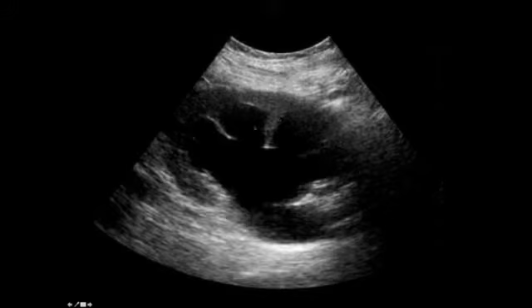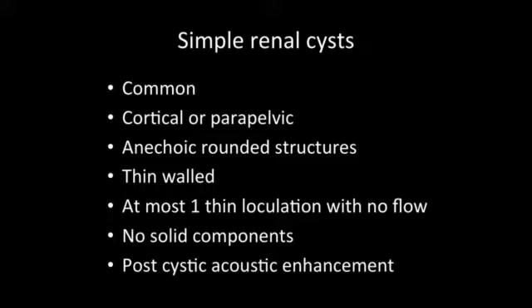Hopefully that's straightforward. Now on to renal cysts. Really all after this course I'd like you to be able to do is to define what a simple renal cyst is, because they're common. And if you see one, you don't need to do anything about it. Having said that, if you see a complicated renal cyst, it needs to be referred, because certainly malignancy can be cystic.